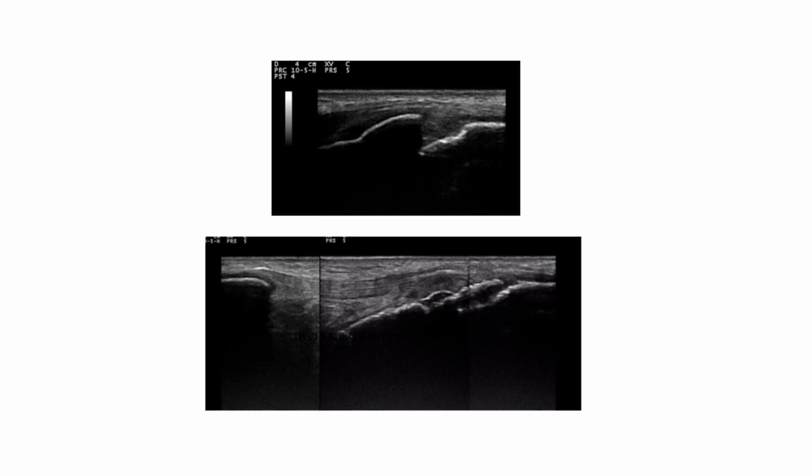There was extensive hypoechoic malformation of the tibial tuberosity, which we considered to be the stage of avulsion and excessive bone formation. Observing the state of the tibial tuberosity damage in Osgood-Schlatter disease by ultrasound, if the symptoms are severe, it is close to the state of avulsion fracture due to traction of the patellar tendon.